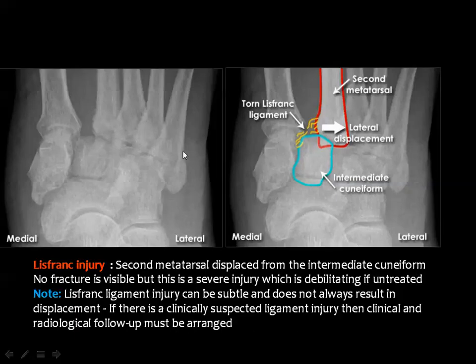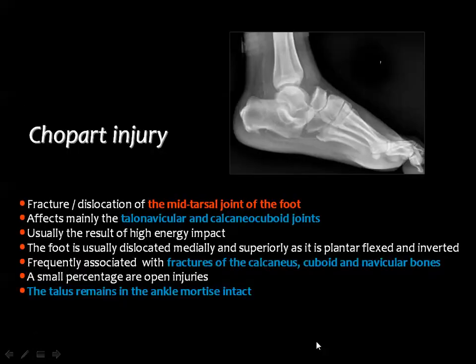And this is Lisfranc injury, and you can see this wide separation between the second and first metatarsal bone. And if you draw a line, you will get the step deformity between the metatarsal and the middle cuneiform or the intermediate cuneiform bone. This is diagnostic of Lisfranc injury.